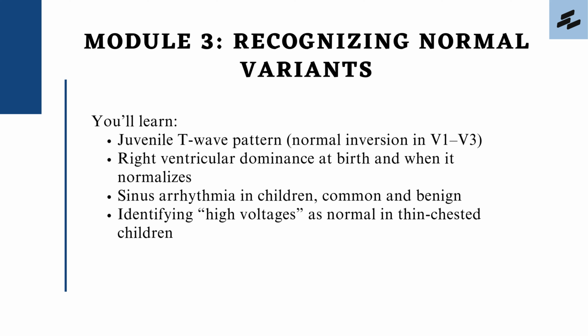You will also learn about sinus arrhythmia, a common and benign finding in children where the heart rate varies with respiration. Finally, we will discuss high voltages in thin-chested children, which may look abnormal but are in fact normal for their body habitus. Recognizing these variants is essential to avoid unnecessary investigations.